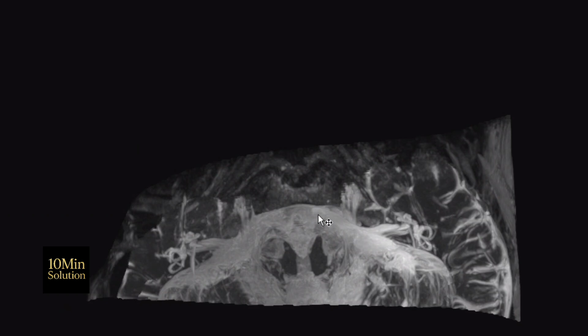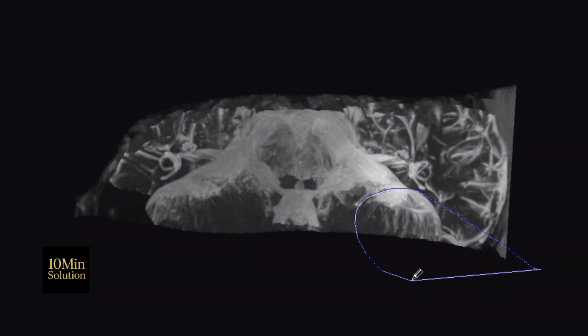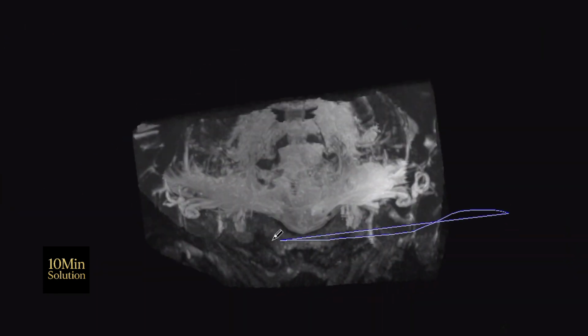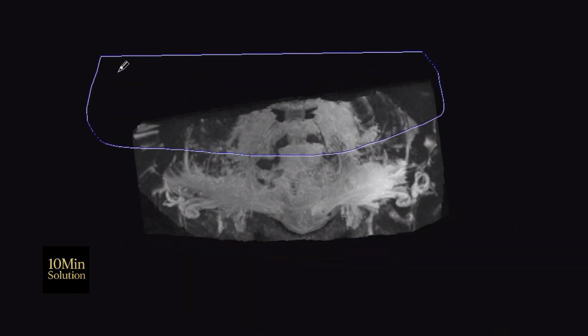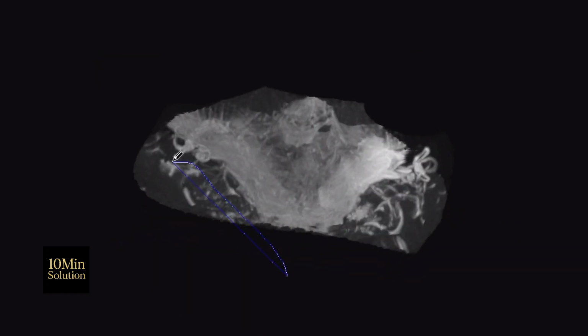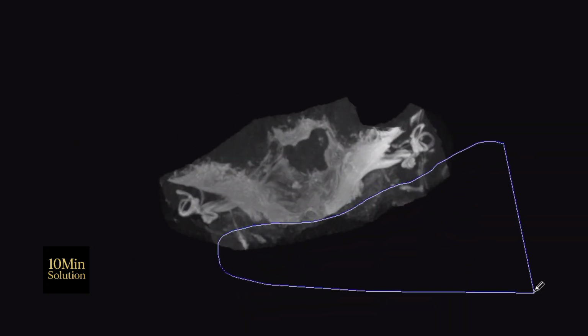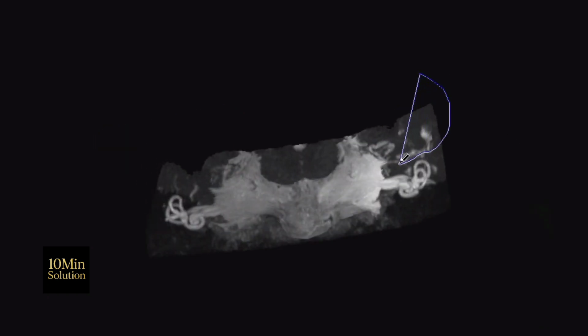Cochlear Imaging Overview. The cochlea is a spiral-shaped structure of the inner ear responsible for hearing. MRI is used to evaluate the cochlea in conditions such as sensorineural hearing loss, congenital anomalies, and vestibulocochlear nerve pathology. High-resolution T2 weighted sequences such as 3D Drive, CISS, or Fiesta are commonly used for detailed visualization.